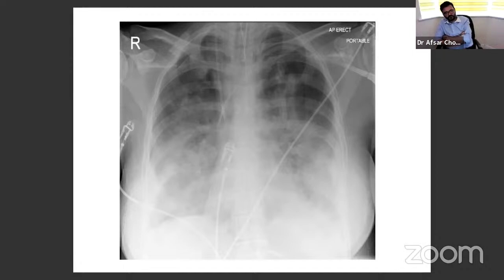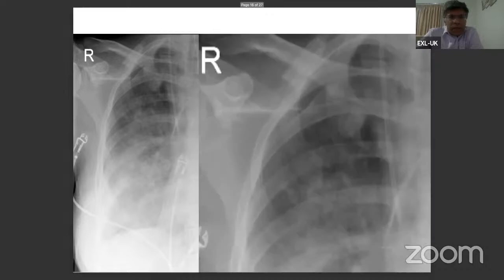So you can see this is another problem with an intervention. As you can see, there are multiple tubes. This is often a problem with X-rays. You have multiple tubes, you don't know which tube is going where, and you can see a central line going down there. And if you look closely, next slide, please. This is a post-insertion pneumothorax. As you can see, that little pneumothorax there.